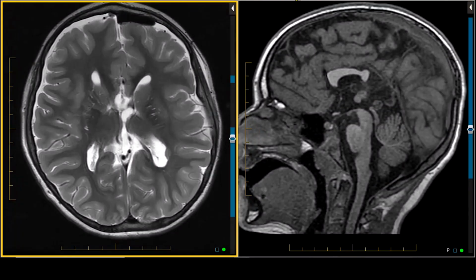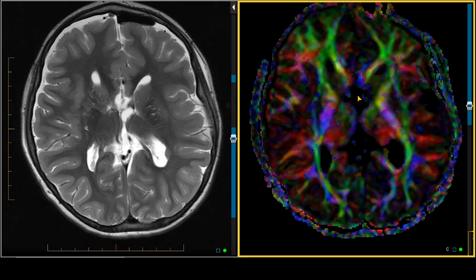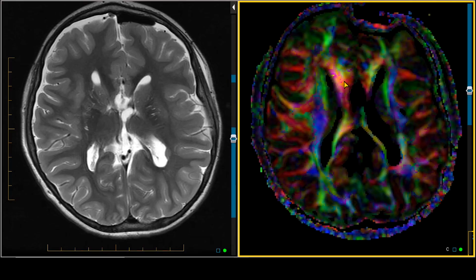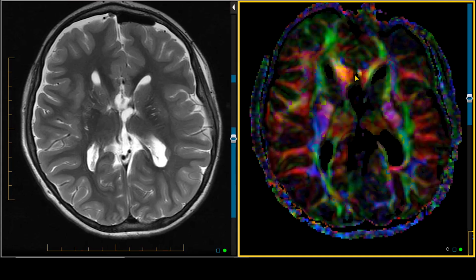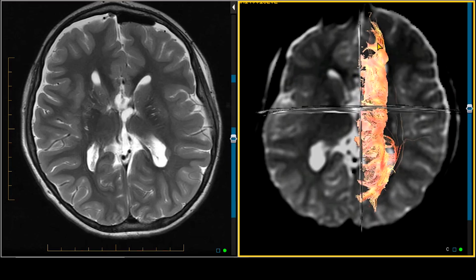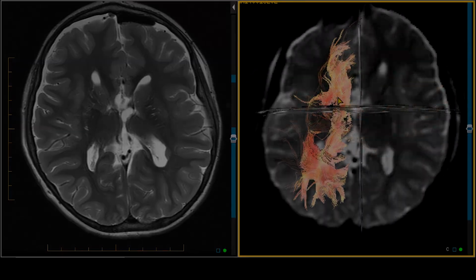One of the things postoperatively we may do is look at DTI imaging. In particular, this is the directionally encoded fractional anisotropy map. Red is the color of transversely oriented fibers, and we can see there's transection of the transversely oriented fibers in what was previously the rudimentary corpus callosum in this individual. We can also process that as diffusion tensor fiber tracking, and we can see these fibers go up to the transected margin of the corpus callosum, but they don't cross over. Similarly, if we do a seed in the contralateral cerebral hemisphere, and we can check different white matter bundles in different portions of the brain, here we do not see any fibers crossing the corpus callosum. These images with the diffusion tensor fiber tracking are one way to show the epilepsy neurologist and the neurosurgeon postoperatively that there has been complete transection of the commissural fibers traversing the midline in the corpus callosum.